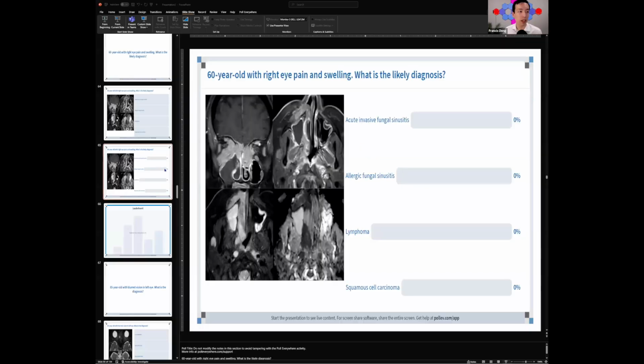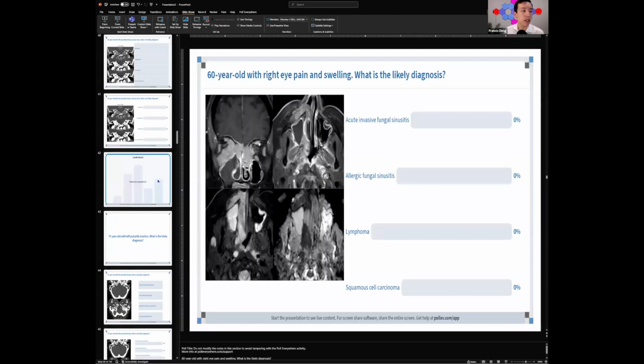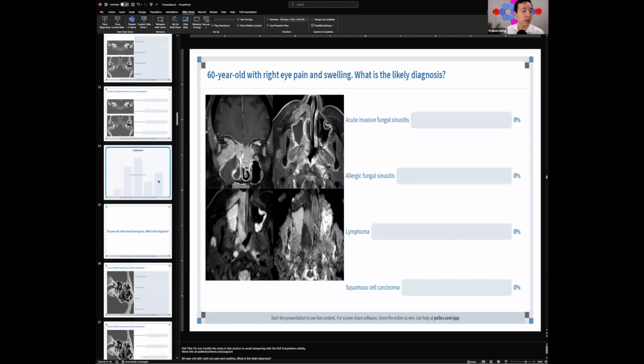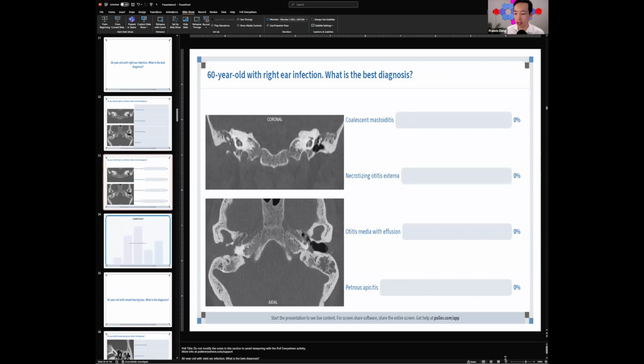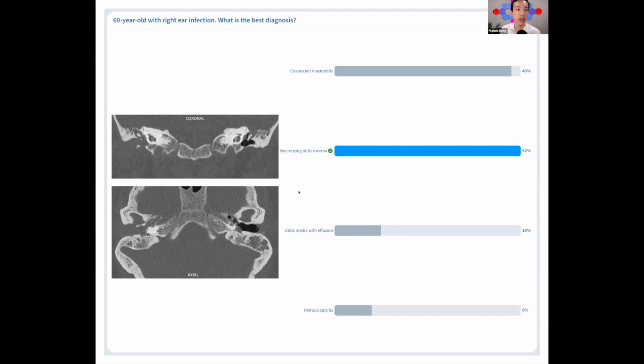Yes, absolutely. It's one of my favorite diagnoses because it is so commonly missed, and it's important to catch if you're ever reading these kinds of studies out in the community. The typical clinical scenario for these patients is that they're an older adult who may have diabetes and have had otalgia or a clinical ear infection for some time.